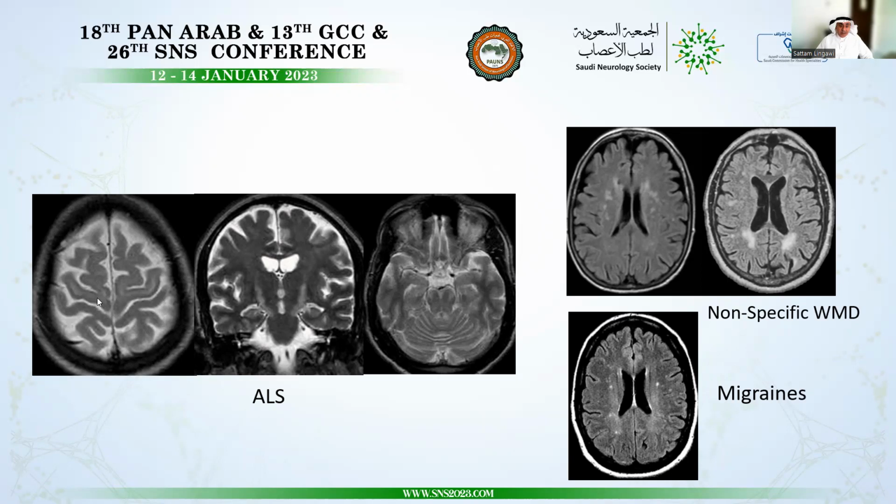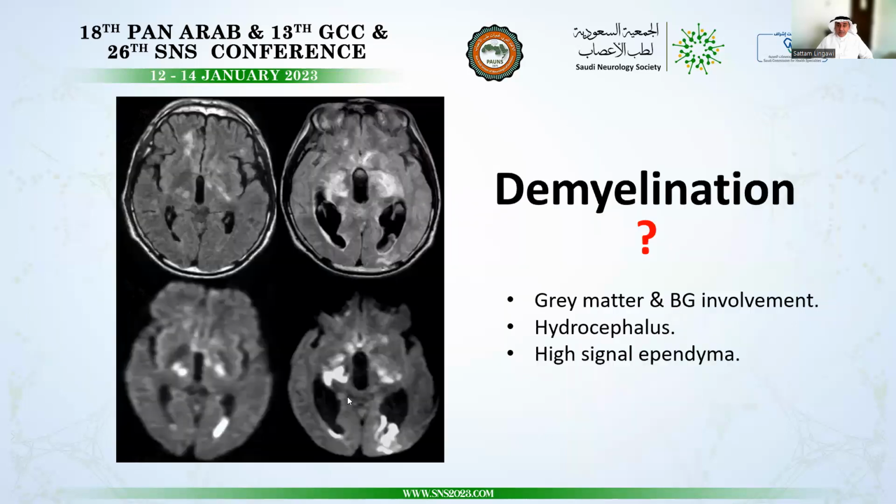There is white matter high signal intensity, homogeneously and diffusely involving the white matter from the level of the motor gyri superiorly, extending in very clear, sharp pathways along the corticospinal tracts down to the brain stem, located within the anterior part of the cerebral peduncles. This is the demyelination of the corticospinal tracts in amyotrophic lateral sclerosis.